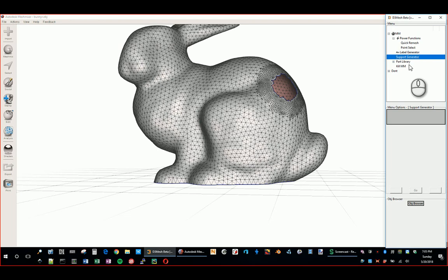The next thing here is something called a part library, and that is essentially just what it is, a part library. It's going to have 3 different subsections. One of them is going to be several tooth libraries that we have that will be available to use in Mesh Mixer, just like the Brennis one is right now. There are a couple of videos on how to add that as a part library in Mesh Mixer, but this is just within this app.